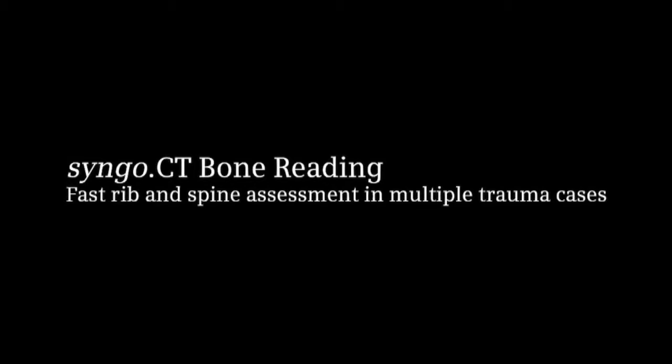Syngo CT bone reading. Fast rib and spine assessment in multiple trauma cases. In trauma cases with suspected injuries to the thorax, Syngo CT bone reading helps you save precious time for a thorough diagnosis of the ribs and spine.